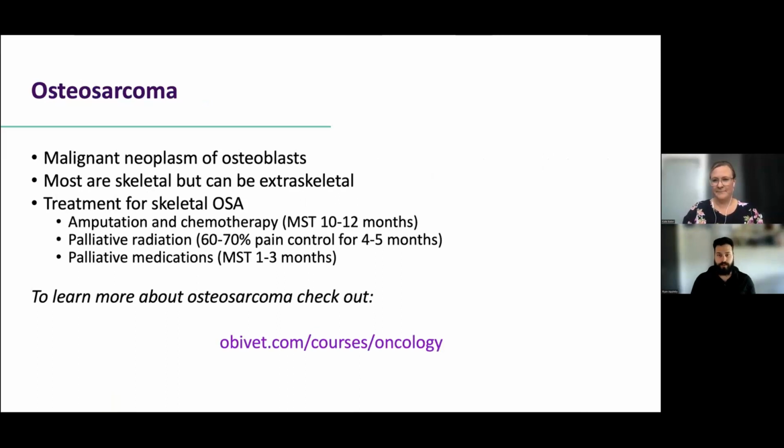Well, that's super cool. I always love looking at those cyto images, especially because I get to see something in color once in a while. But seeing those features that are helping you differentiate between any other type of tumor, really focusing in to make it the osteosarcoma instead of just sarcoma, those are great little tricks of the trade. And looking for that osteoid, that little pink hazy matrix, that's really neat. I've always seen on the cytology reports, there's evidence of osteoid, but I didn't know what it looked like. So that's great. Thank you for that. Appreciate that.